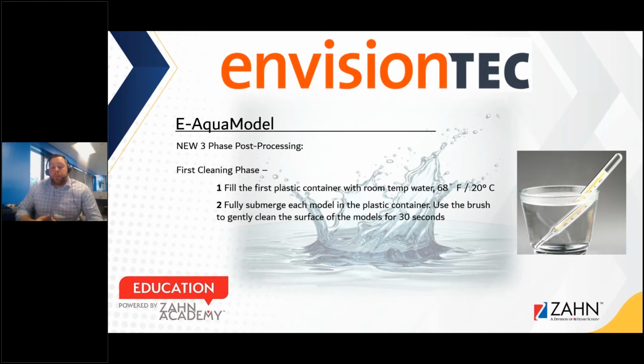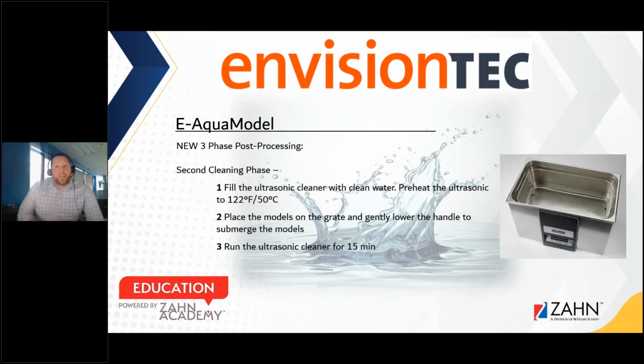Then you make sure all the models are fully submerged, so the water encapsulates the model and contacts all surfaces, making sure all uncured resins are soluble within the water. We only leave it in there for about 30 seconds, so it doesn't have to sit as long as it would in a traditional IPA bath.